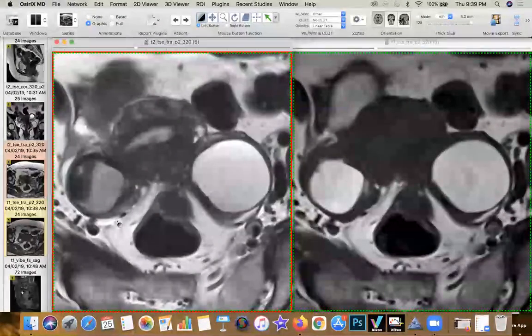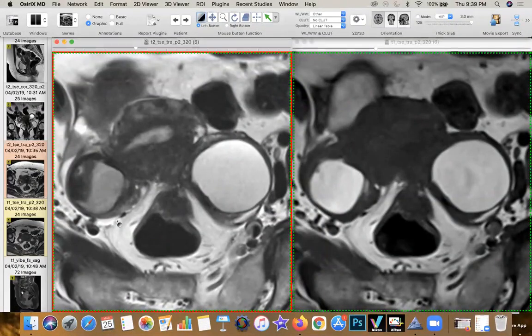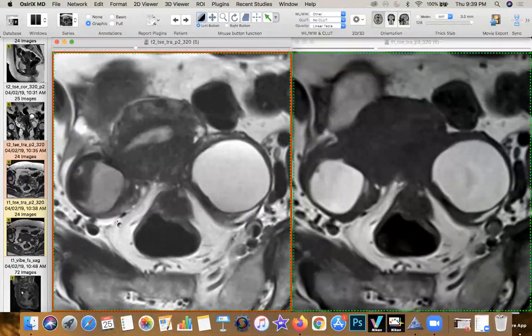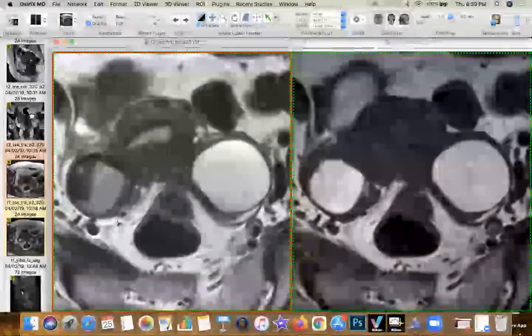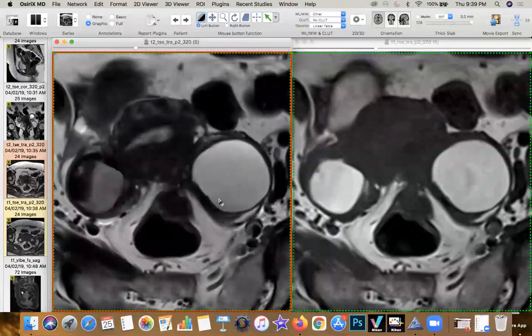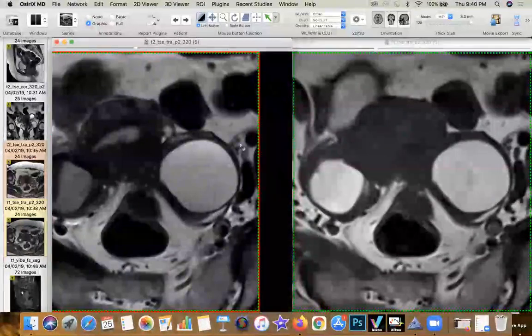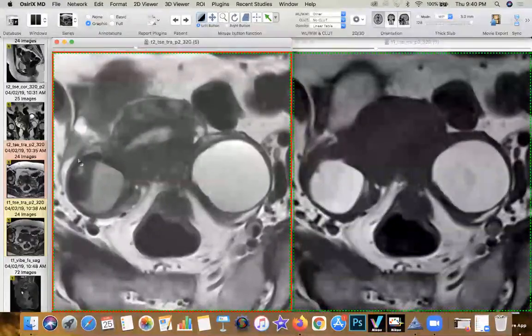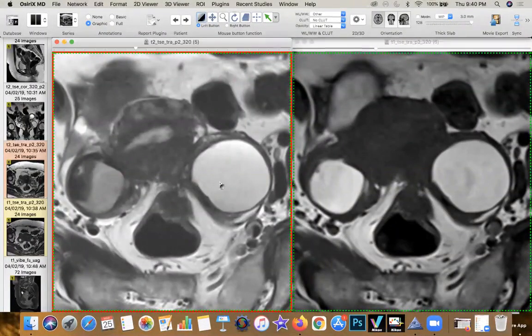And it's simply because of 2 reasons. It's the admixture of protein or myxoid matrix with the presence of iron of various ages, which actually occurs due to recurrent bleeds or rebleeds within these ovaries. And that shading can be very variable. So you could get it as very subtle. If you look at this carefully, you can see a subtle shading effect coming here. You have a gradient, or it could be as dense and as jet black as you're seeing in this ovary sitting up out here.